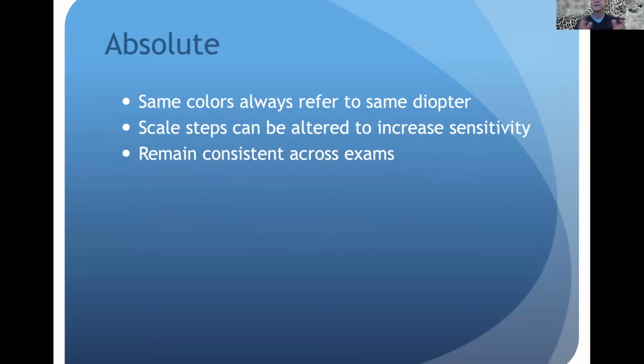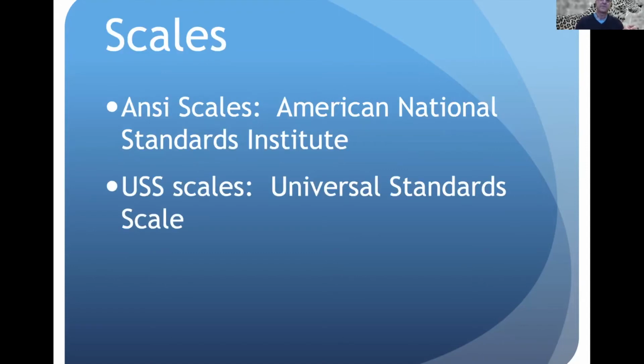And there's a big difference depending upon the size of the steps. I'll show you some examples that try and hammer that home, that it really matters, the size of your steps. But at least this gives us some consistency, and we at least have a chance of comparing maps from different machines.